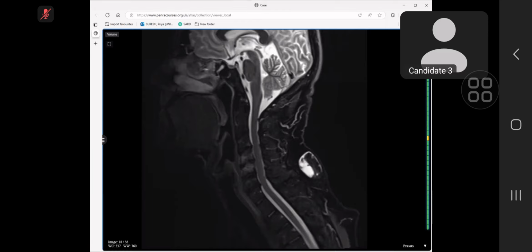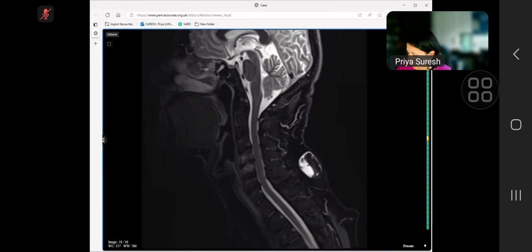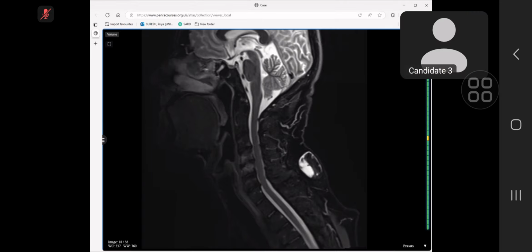Maybe a myelolipoma or lipomyxoid, some benign lesion. I don't remember right now. So do you think this is benign or malignant? As the lesion is showing no enhancement, this is most likely benign. And it has been present over a period of 2 years, so this is also in keeping with a benign lesion.